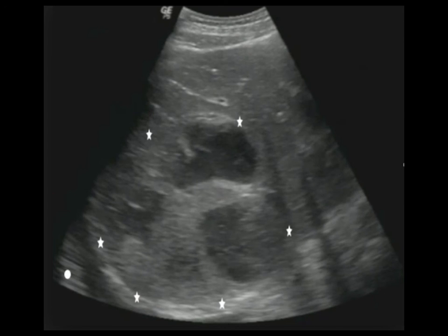Here's an example of a pyogenic liver abscess. Note it is different from an amoebic liver abscess in that it is loculated and multifocal. These are often secondary to polymicrobial infections and require drainage and broad-spectrum antibiotics. Mortality of these is around 10%.